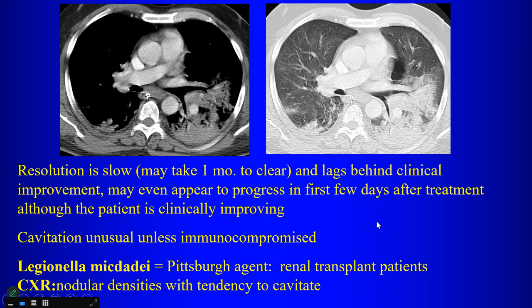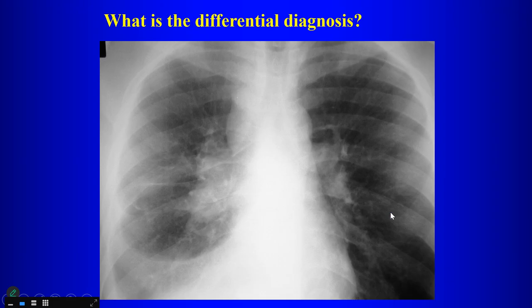Consolidations here from Legionella pneumonia. It may take a long time to clear, can lag behind the clinical improvement, and may even appear to progress a few days after treatment, although the patient is clinically improving. Usually we don't see cavitation associated with Legionella pneumonia.